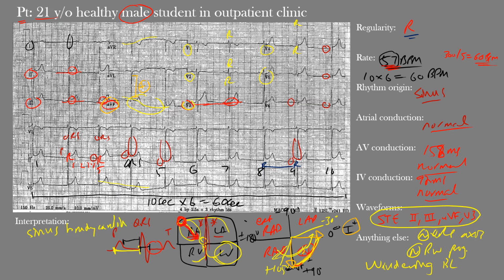Okay, all right, with benign early repolarization. And why do we say sinus bradycardia? Well, we have sinus rhythm, the rate's below 60, and again, those ST elevation changes that we mentioned are what we call early repolarization in these males that don't have any issues and are asymptomatic. This tends to be a benign finding.